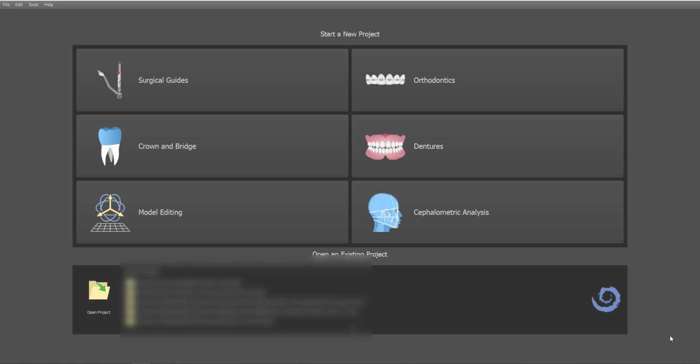You're going to need a true CAD proposal with the teeth in the ideal occlusion and position and aesthetics and all of those things. A typical case might be patient is missing numbers 7 through 10. Well, you could throw some library teeth in there and it'll be close, but when you're trying to plan as precise as you need to for an anterior aesthetic case, it's more ideal if you'll go ahead and do the true full crown design with the ideal occlusion, ideal gingival borders, and ideal contours to the teeth, and then plan your implants from that. So this is really an easy case that doesn't justify that, but it'll be good for demonstrating this.